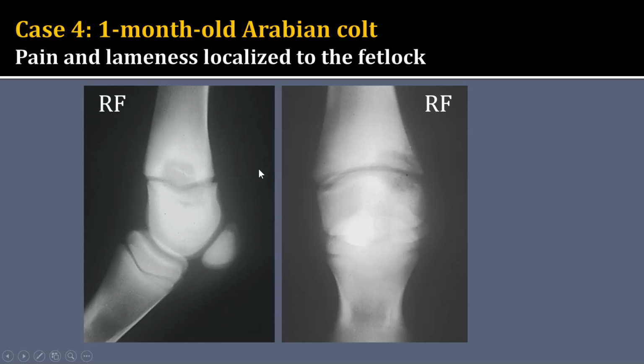When I look at the osseous structures, everything is pretty normal with the exception of this focal area of geographic lysis, and it is in both the metaphysis as well as extending into the epiphysis, fairly centered on that distal physis there. When we look on the orthogonal view, I can see that it is very focal at the lateral aspect of this bone, again centered on the physis with lysis in the metaphysis and the epiphysis.